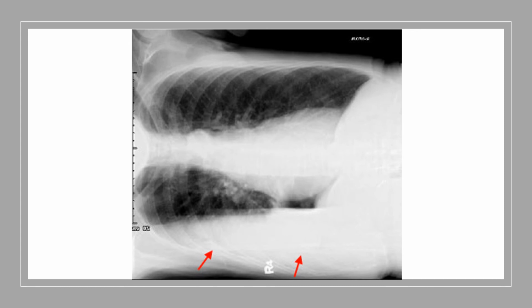So this would be a lateral decubitus. The big thing with this one, we're going to have the patient lay down. Normally the lungs should be symmetrical. Normally you should see exactly what you see with this one up here, obviously except for the heart structure, but you should see the same column shape. But down here, we have the same shape of the lung until we get to this flat point.